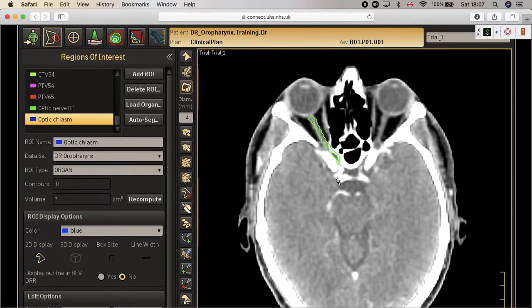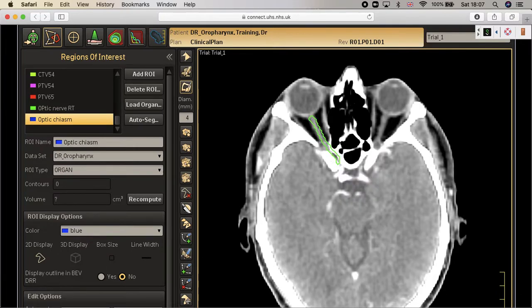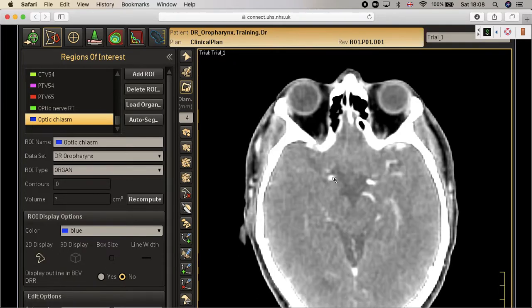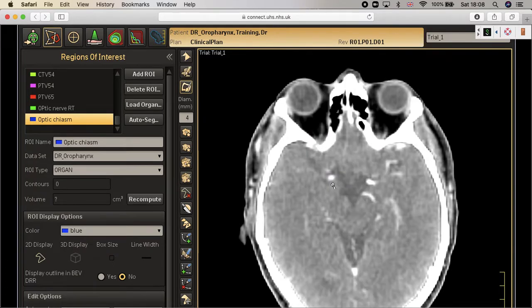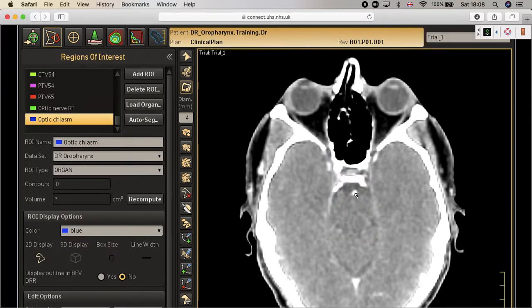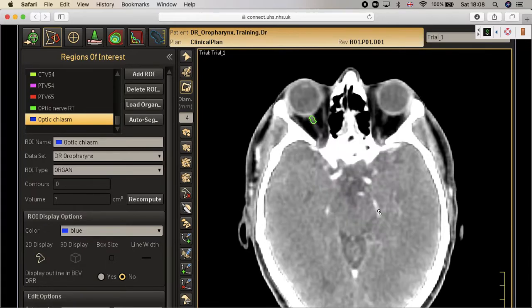If you remember with me, the internal carotid, after doing the siphon S-shape course, will give us two important vessels. One is called the middle cerebral artery, and the second is called the anterior cerebral artery, and you have to familiarize yourself with that. The posterior cerebral artery will come from a very nice vessel here in front of the pons called the basilar artery. The vertebral vessels will come together to make the basilar artery. The basilar artery will divide into the posterior cerebral arteries.